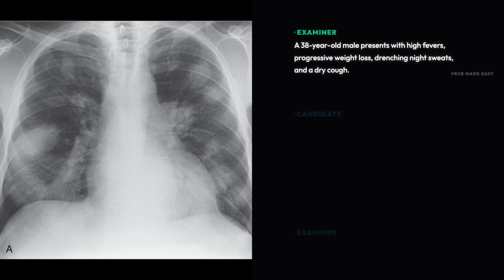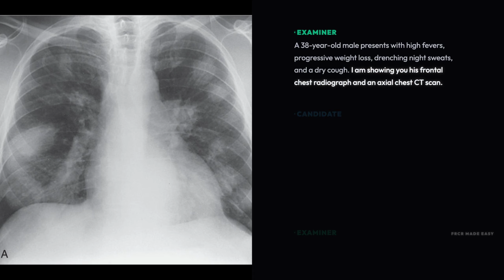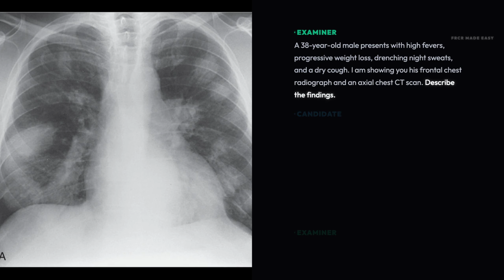A 38-year-old male presents with high fevers, progressive weight loss, drenching night sweats, and a dry cough. I am showing you his frontal chest radiograph and an axial chest computed tomography scan.